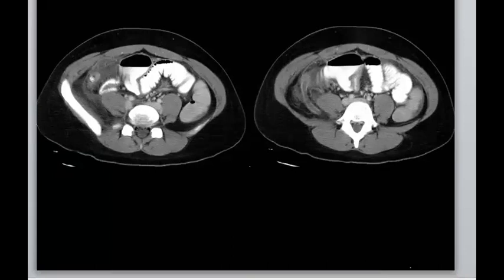We mentioned some rules. When you find liver cirrhosis, you mention HCC. When you don't find liver cirrhosis in the liver, you mention metastases. So when you find right iliac fossa stranding, this is appendicitis. Perfect. When you find right iliac fossa fat stranding, smudging, misty fat, anything, dirty fat, you are going with appendicitis. The most common is appendicitis.